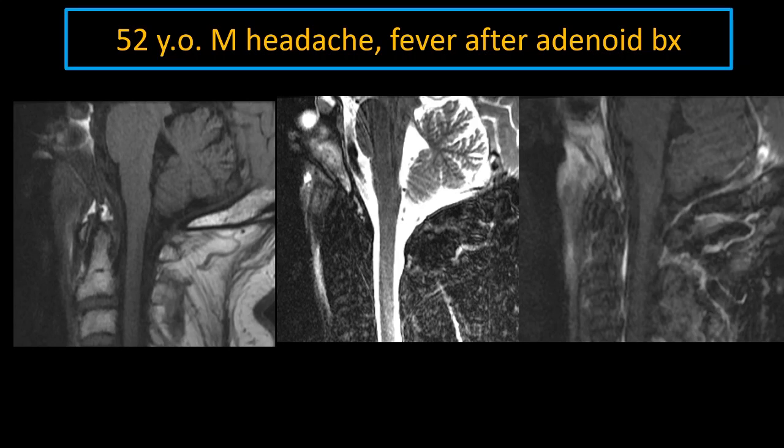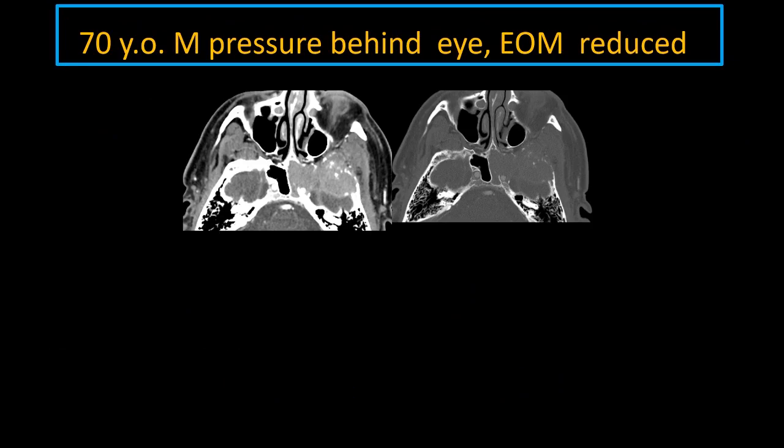Upon further questioning, the patient had indicated that following his recent biopsy of the adenoids, he had used cocaine, and this was felt to be a complication of the use of cocaine with an opened wound in the nasopharynx. So a nice example of central skull base osteomyelitis. You can also see osteomyelitis in the central skull base complicating malignant otitis externa.